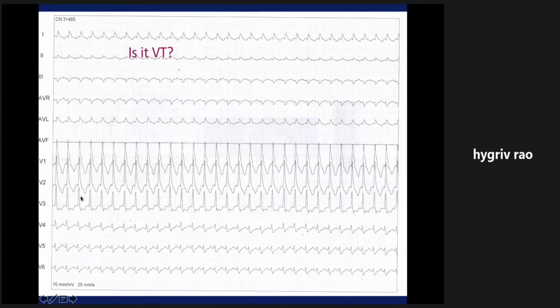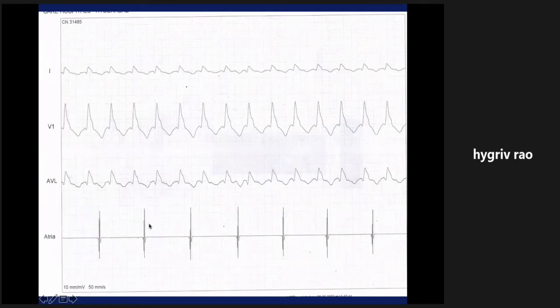And then you see the proof of the pudding is in the eating. I'm going to show you, this is an electrode in the atria. And you see now the same things which I showed you. Whenever there is a P wave, an atrial electrogram, you can see a deeper QRS-T wave. This is shallow, no P wave. And here is a deeper one, there is an atrial electrogram P wave. So whenever there is a deep wave, we know that this is a retrograde P wave. Now you can see that there are so many V's, only a few A's. This is a VA dissociation. More V's, fewer A's. Diagnostic of VT, there is no differential diagnosis.